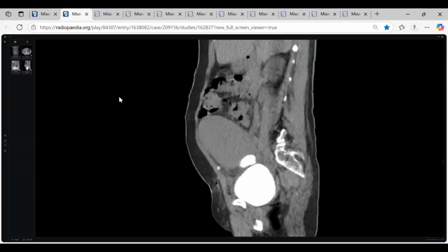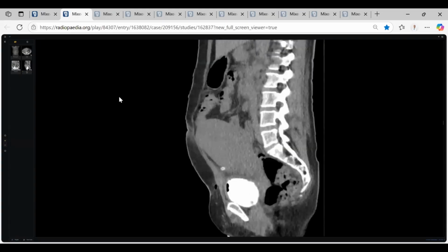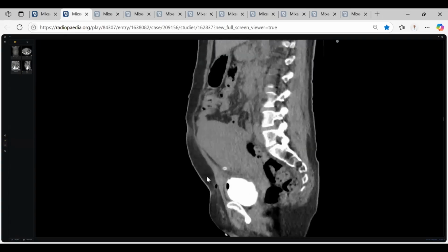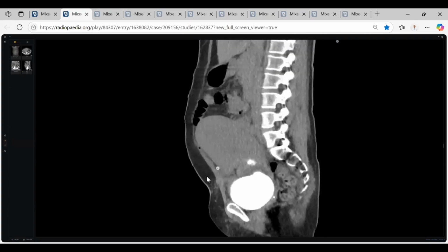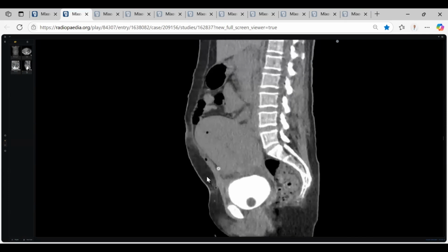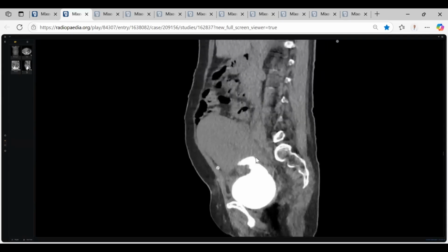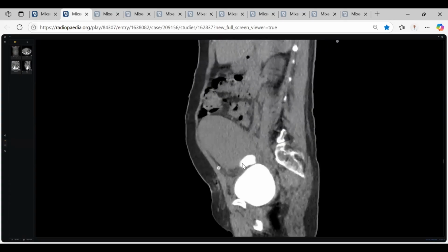Thank you, doctor. You did very well. Especially, I hide the most important part of the history. Many examiners will do this, because if I told you there was a section, you would easily pick up the finding. There is a superior outpouching, but actually this is a rupture, a rupture due to injury during the CS, and it is very common in practice.